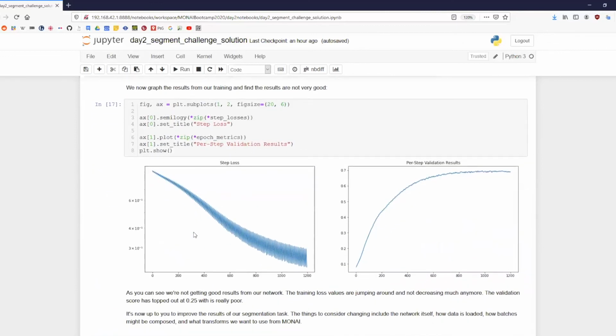And then when we look at the results, it's still topping out at, say, 0.7, but just much better than what we were getting before, which is like somewhere around 0.2 something or other. So we're getting quite a bit better results by adding our randomization and by adding a little bit more regularization through dropout. So let me just rerun this.